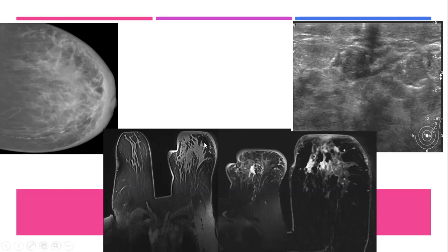This is pre-contrast and these are post-contrast; it is isointense on pre-contrast. Pre-contrast does not show masses. It demonstrates only diffuse edema. The breast is enlarged with thickening of the parenchyma as well as the skin.